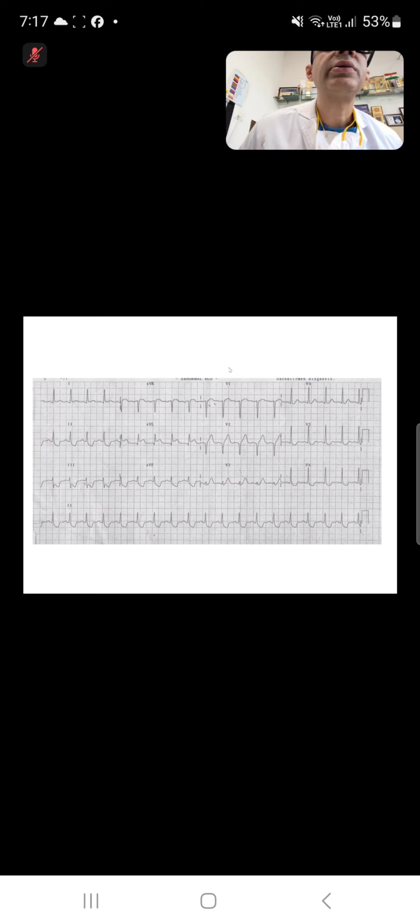Video is moving for others. Yes, that is moving, Farhan. I don't know in your case why the ECG is not moving. Nagendra Prasad, would you like to read this ECG?